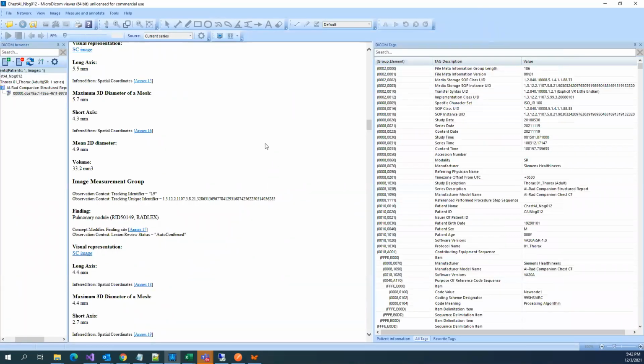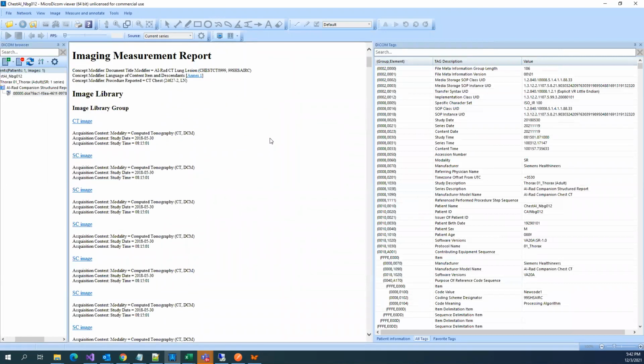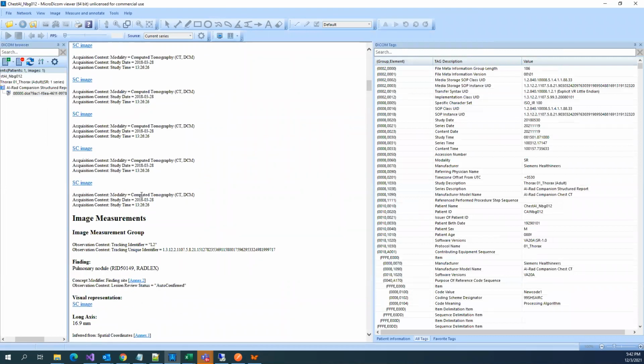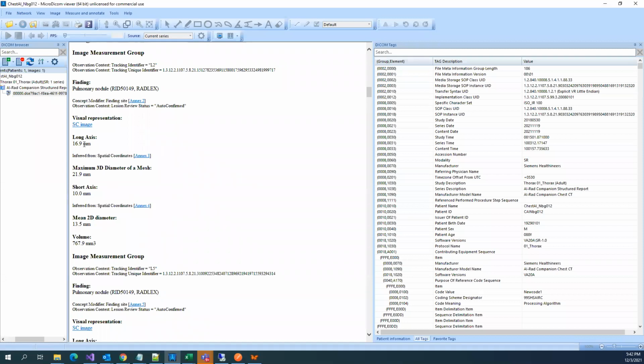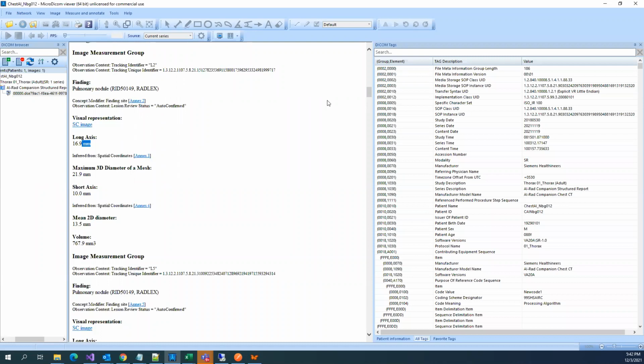This time I'm showing you lung cancer one. If you just see this lung cancer one, it is very detailed, with multiple measurements, which talk about the different pulmonary nodules on the lung, the size of each nodule, and the different dimension parameters which will help to identify and measure these nodules. So this is what we have with respect to a DICOM SR.